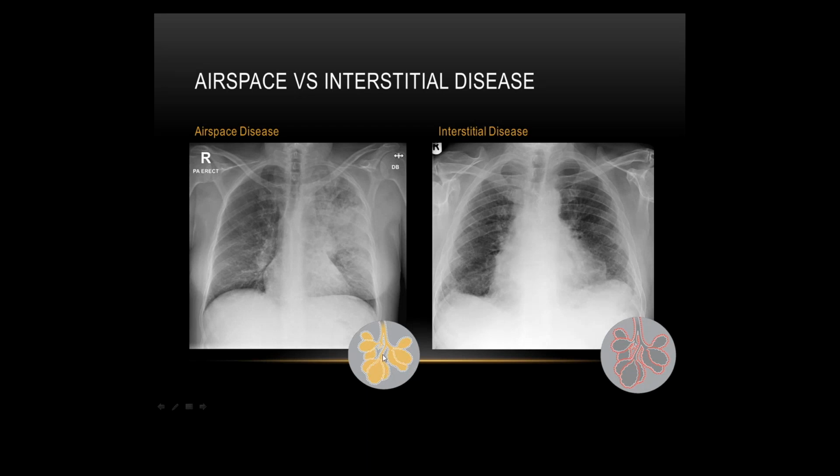So what happens is, if you think about your anatomy, because of the millions of alveoli, it's them that are being filled with the material. So you don't tend to get any straight edges, because it becomes fluffy and consolidated as it spreads throughout the lobes. It can be lobar, multi-lobar, segmental, or confluent. It can have a range of appearances, so that's when it gets a bit tricky.